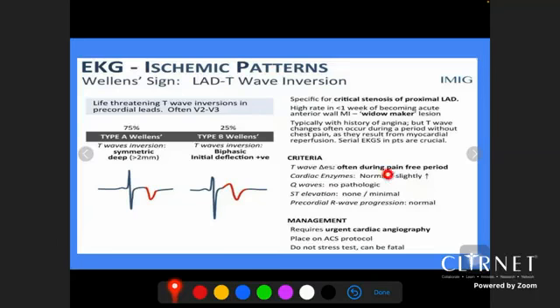T-wave changes often appear during the pain-free period. As we said, this indicates reperfusion rather than occlusion here. So there is a little occlusion and opening, there is reperfusion, and this sign is showing that there is some critical lesion which is about to close. ST elevation is none or minimal. This is the trick, that this is not STEMI. However, it should be managed as STEMI is about to happen. Reciprocal changes and R wave progression are normal.